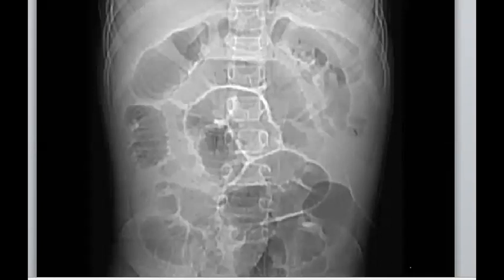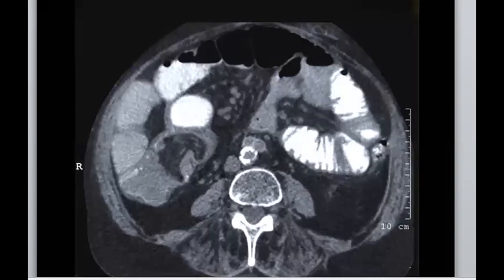No, but yeah, maybe there is obstruction. You mean that there is obstruction, and good that you think about pneumoperitoneum, that you will search for any sign. Okay, nice. But there is small bowel obstruction, and you will search for the cause of the small bowel obstruction. You agree? Let's have a look and try to find the cause.